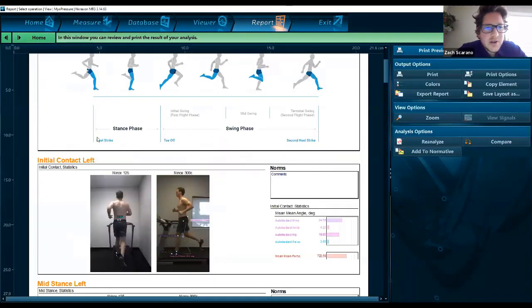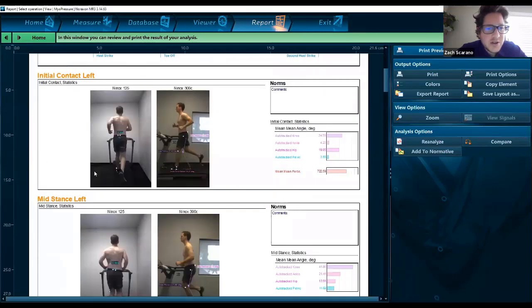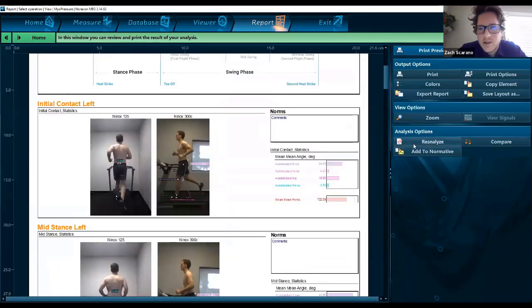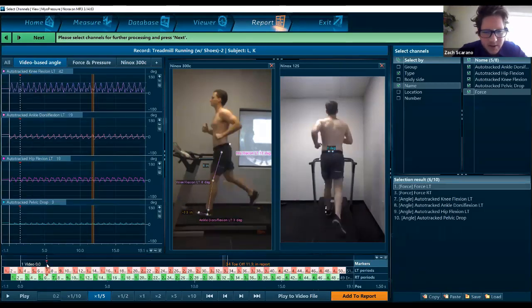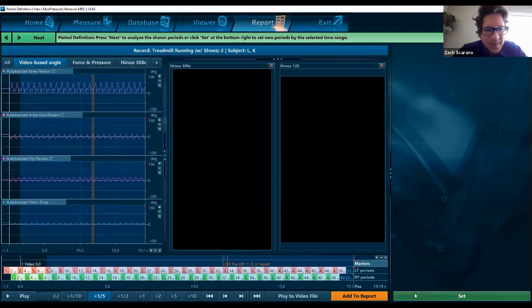And now it's going to automatically separate and position these pictures so that we can see it's taking those initial pictures. It grabs the images from the first phases, and as you can see, we started our drawings at 0 and not at the negative time point here.